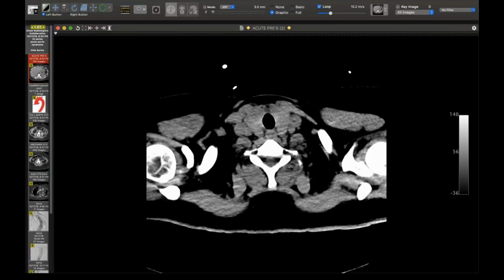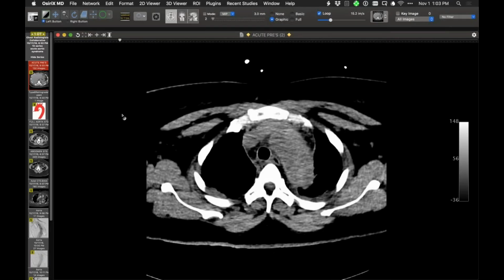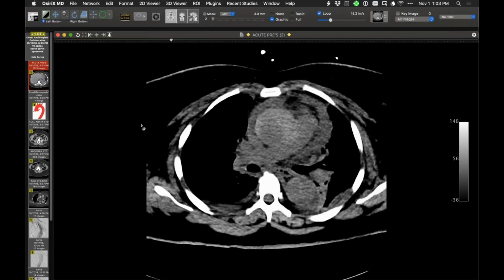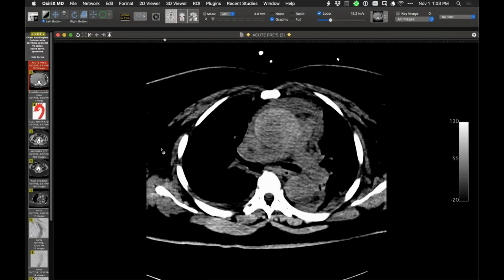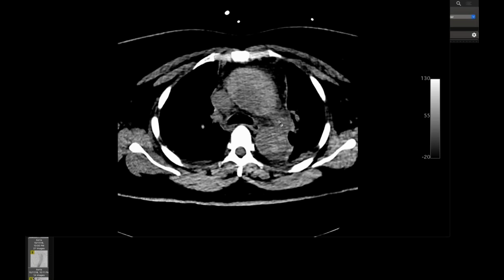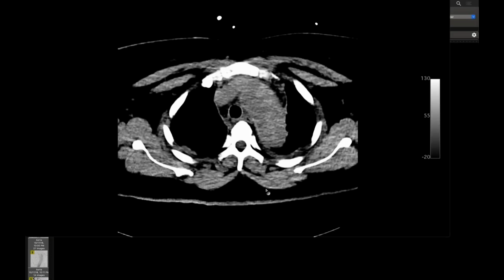Good. All right. Here's an interesting patient that was imaged for acute aortic syndrome. Here on the pre-contrast series, I know it's a bit noisy, but if I narrow the window width to improve the contrast, one can see that there is substantial high attenuation abnormality in relation to the ascending aorta at a minimum, going into the aortic arch as well, distal aortic arch as well.